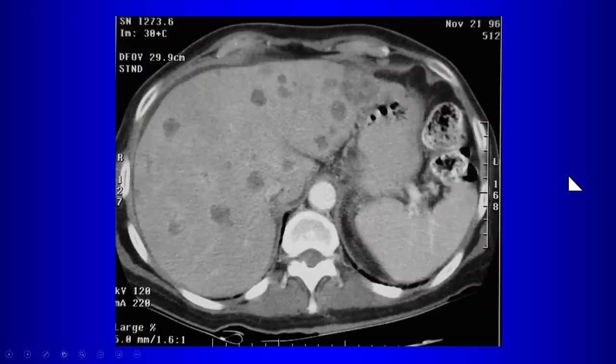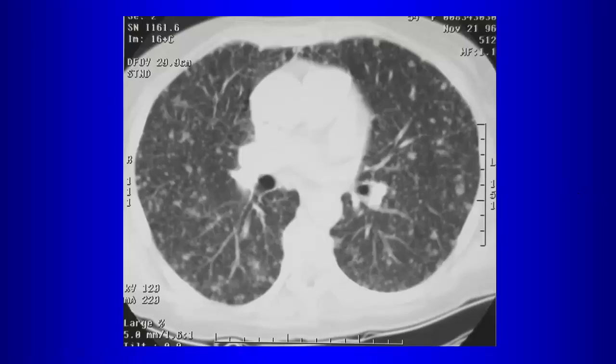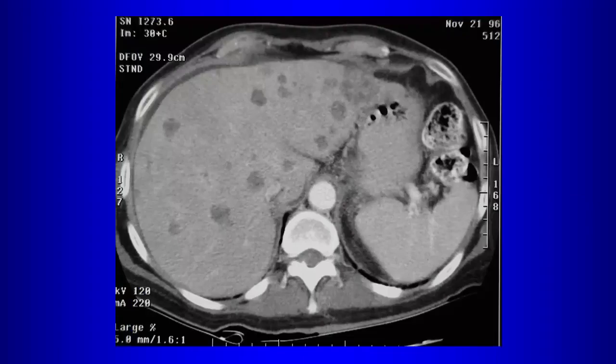Okay, so this patient also has this interesting finding. Of course, when you have a random distribution of nodules, the first thing that comes to mind is, that's not the first thing. Yeah, TB, miliary TB or miliary fungal infection. But this patient has this finding, which is metastatic disease in the liver, right? So mets can also give you a micronodular pattern.